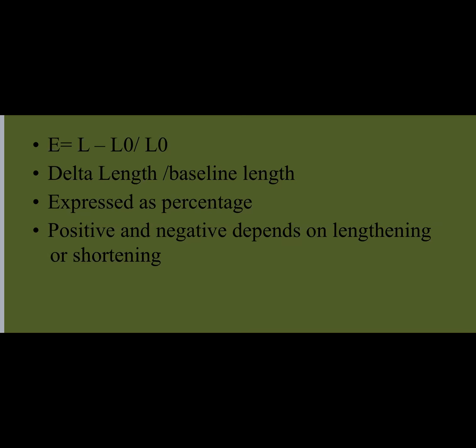So this is echo. This is the state of the art echo. Everybody now, every conference you go to, they are talking about strain and strain rate and deformation. So we probably have to know about that one. Now the strain and deformation imaging is now one of the emerging good ways and going to be the best ways of assessing LV systolic function.